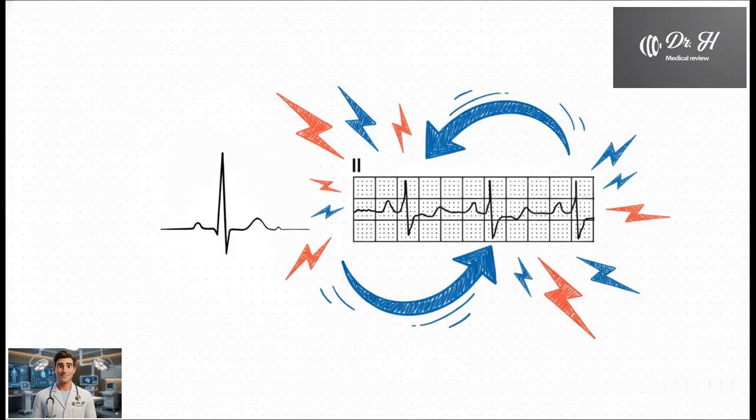So let's just visualize what I mean by positive. On this ECG strip here, you can see that the main spike of the QRS complex is clearly pointing upwards, away from the baseline. That's a positive deflection. It's really that simple of a visual check in lead I and aVF that makes this method so fast.